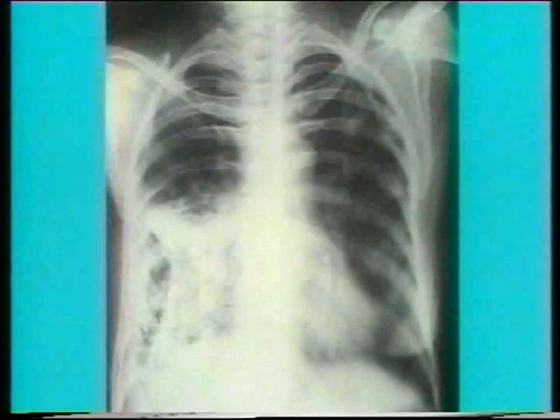This is another typical pleural calcification. It is a very dense and irregular sheet-like opacity with no fixed distribution pattern. Note the sheet-like opacity denser than the ribs with no fixed pattern.